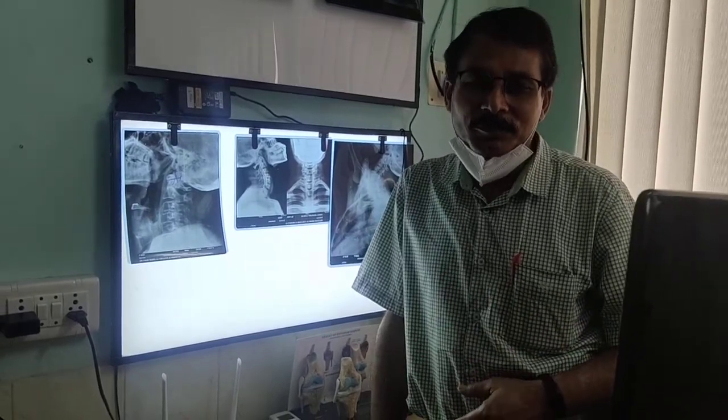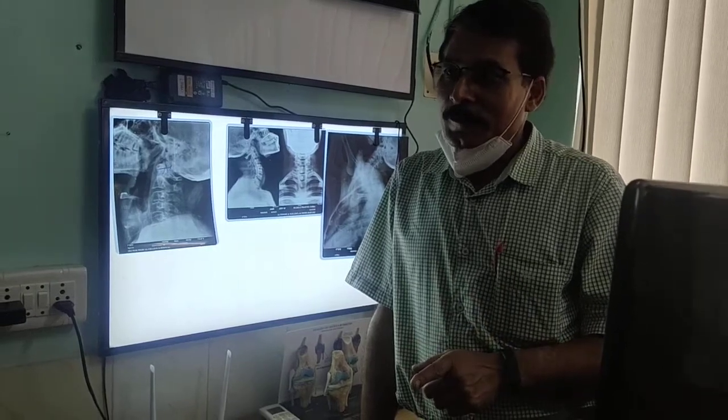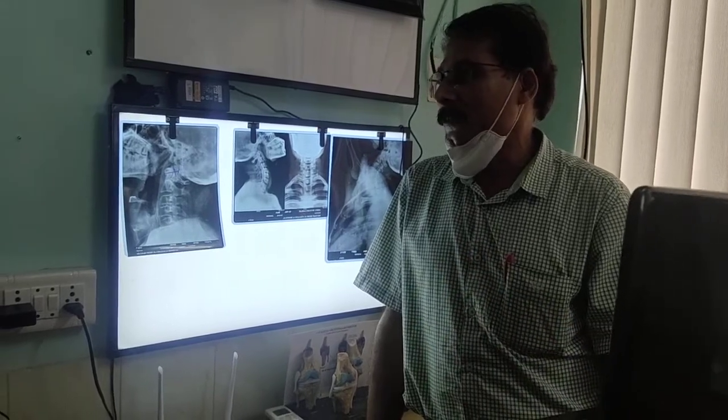That is why sometimes we take indirect guidance. This is actually what we are going to talk about: indirect evidence of instability. What is that? Indirect evidence of instability means not the direct one, but indirectly you are supposed to understand how to calculate it to know that there is some sort of instability. This is because of the ratio or the relationship basically.